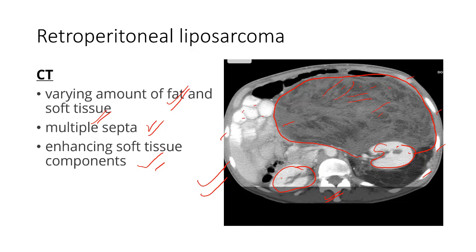So what they are trying to tell here is, if it is retroperitoneal liposarcoma, fat is present in AML also and fat is present in liposarcoma also, but because it is sarcoma, soft tissue component with multiple septation should be present there. Was it present in our case? No, it was not present in our case. So our diagnosis is probably going towards AML till now.